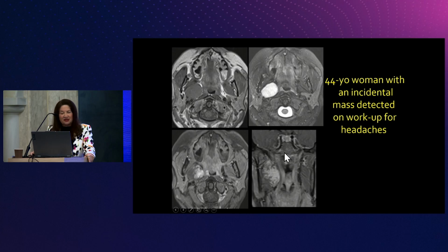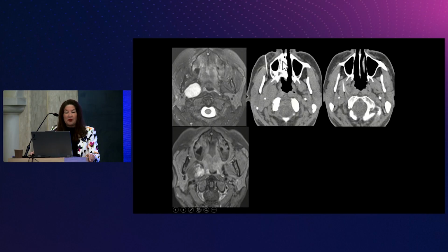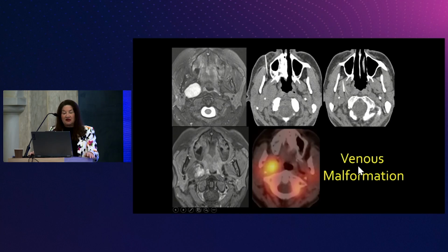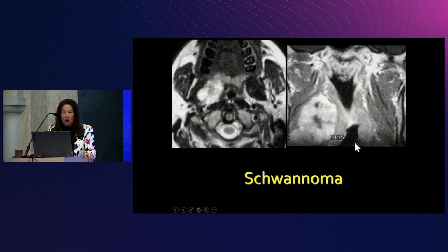robotically. And I looked at it and I just didn't feel it was like a classic benign mixed tumor. So I biopsied. I stuck a needle in, and I got back venous blood, lots of venous blood. They went to pathology, no cells. It was just blood. So then I said, well, let's get a technetium red blood cell scan. So here's your tagged RBC scan, and this is a classic venous malformation. I've been following her now for 10 years. No surgery. This is just a developmental venous malformation that she's had her whole life.